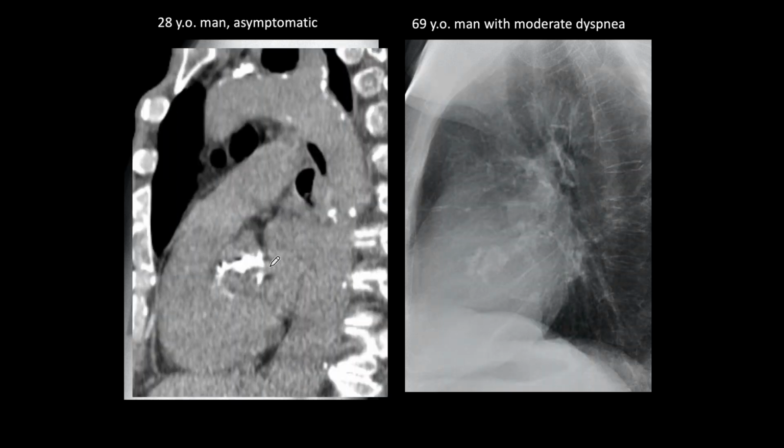The other patient also has calcification of the root of the aorta. The aorta comes here. It has not been included, this calcification. That also corresponds to aortic valve stenosis with calcification. The age of the patient is important because the young person has to be operated on. In an older person, it may be sort of an aging change, secondary to the age, and they may or may not be operated, has to be qualified by a cardiologist. That is something that you see inside the cardiac shadow occasionally.